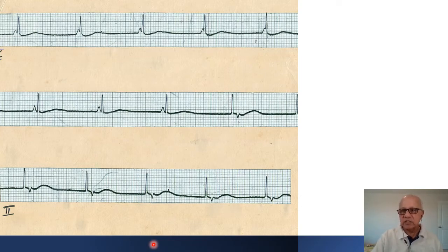The commonest diagnosis here would be a degenerative disease of the sinoatrial node or sinus node, which is called the sick sinus syndrome. Now, this sick sinus syndrome can also be caused by other medications like beta blockers, calcium blockers, and antiarrhythmic drugs. Damage to the SA node during surgery can cause it. Various inflammatory diseases like myocarditis can produce sick sinus. And of course, ischemic heart disease can always produce a sinus bradycardia with a junctional escape rhythm.